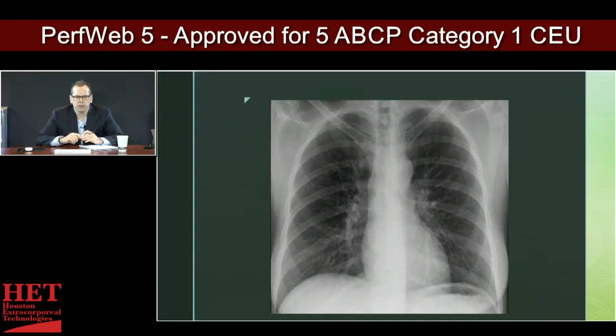This is a patient that does have some vascular congestion, and it can be subtle to pick out, which is why it's always important to take this in the context of the patient that you're dealing with. If this is a 16-year-old kid that comes in, this may be just related to the poor technique of the film. If this is a 75-year-old lady with a known history of coronary disease, diabetes, frail, has got a depressed ejection fraction, then the findings become pretty obvious.